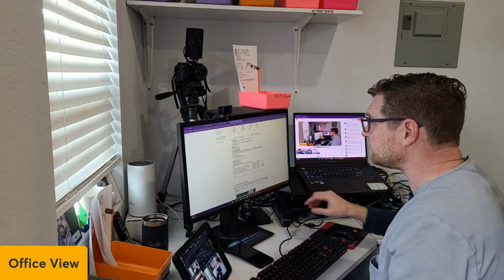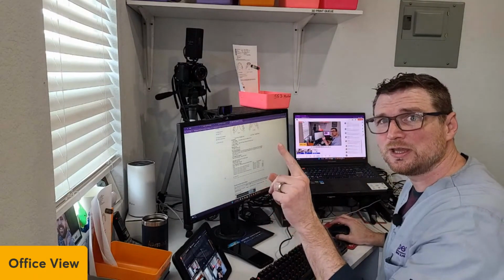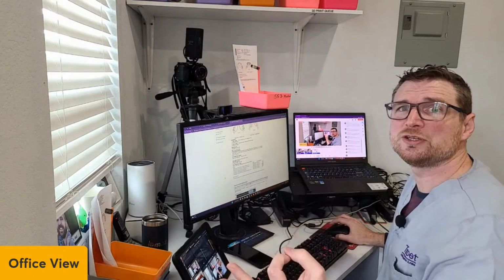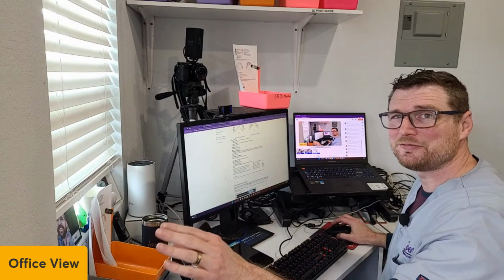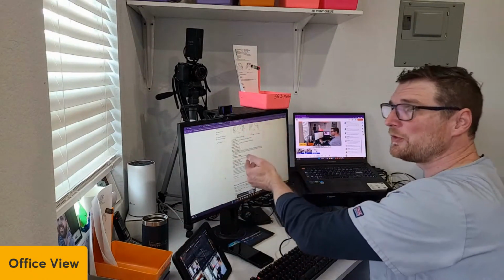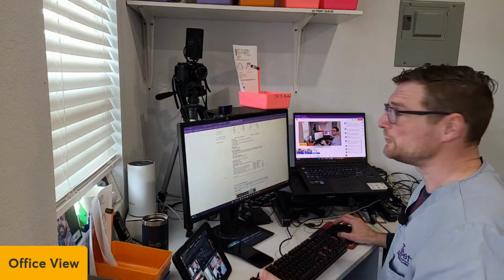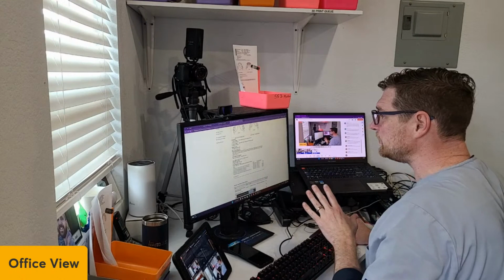So I'm actually going to choose an optimized one because the auto base feature only does it to originals. So you could actually bypass the failure by downloading the optimized version, re-uploading it, and then EasyRx thinks that's an original again, and then you can try it that way. But I'm going to use this time to do this one.